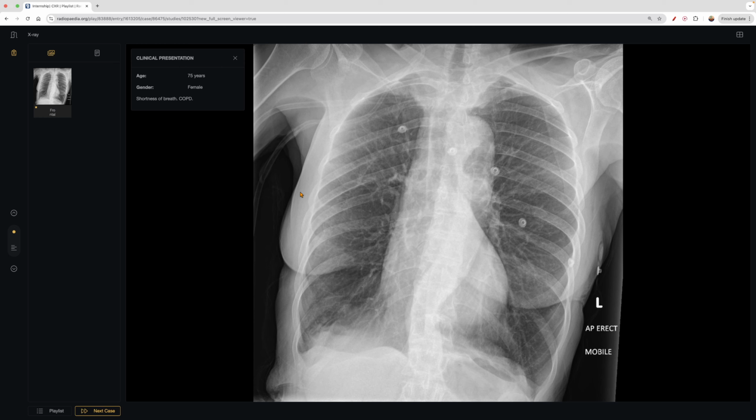Alrighty, so for this patient here, let's see. We're going to do our search pattern. The anatomy is not in view, so it automatically makes the quality of the image lower than usual. But fine, we work with what we have, and then we come down. Not seeing anything. The costophrenic angle looks relatively fine. It looks a little funky, we'll say, but otherwise fine. Pulmonary vasculature, again fine. And you can see how this looks normal. Costophrenic angle looks a little weird, but it's fine. It doesn't look as blunted, perhaps, but we go across, come down, and there's not much more to remark. And you can see the mediastinum, how much different it looks comparatively to the other patient.